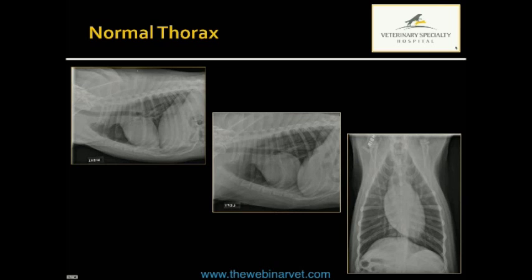That way you've made your assessment or conclusion on that particular organ system, rather than trying to interpret one view and go on to the next, which ends up being quite illogical and I think can confuse you in the end. So the first thing, you want to make sure your positioning and your radiographic technique is adequate. Certainly technique is much more simple with digital radiography. And we're not going to get into the nuances of technique right now in the interest of seeing more clinical cases here.